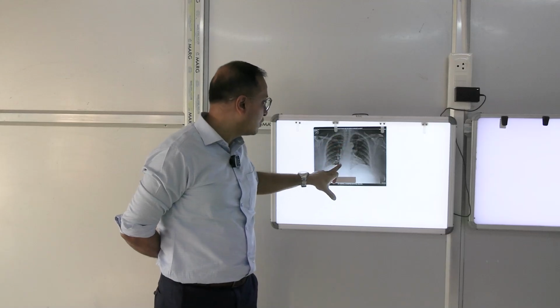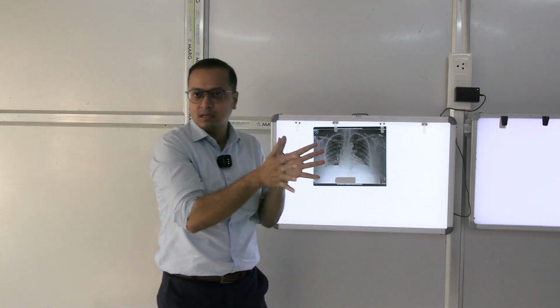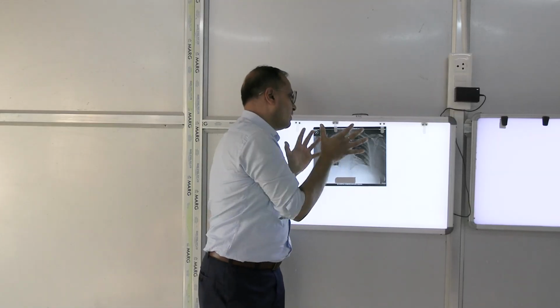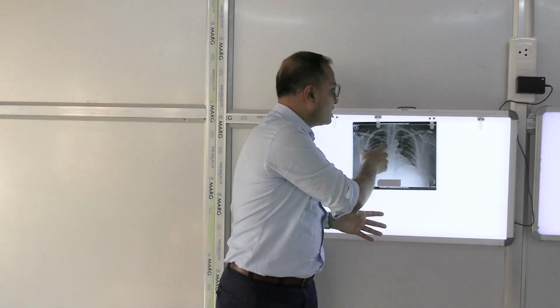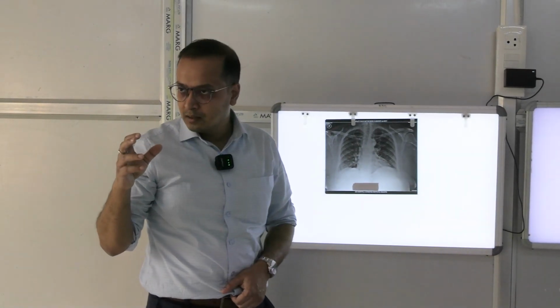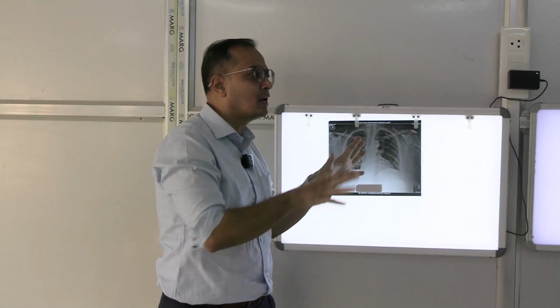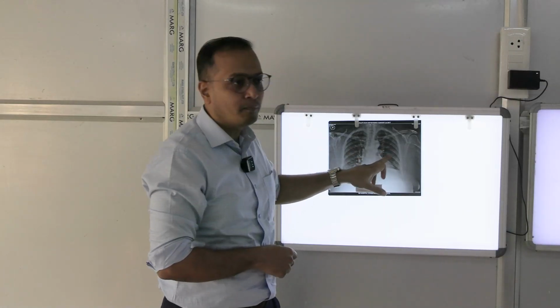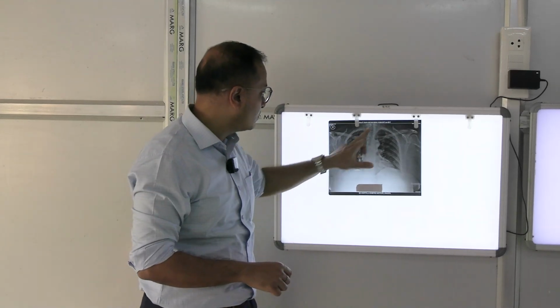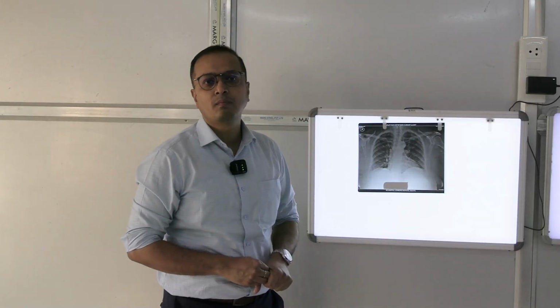This is the lung shadow, or lung parenchyma, into which, through the hilum, the bronchus, bronchioles and blood vessels are going. Those shadows are also presented whenever the X-ray penetrates, so these markings are visible because of this. Along with that, we have pulmonary lymphatics in the lung. Those lymphatics also present markings, making white shadows that look like branching trees. We call these bronchovascular markings. So within the outline of the lung, the white tissues you see in between are called bronchovascular markings, right.